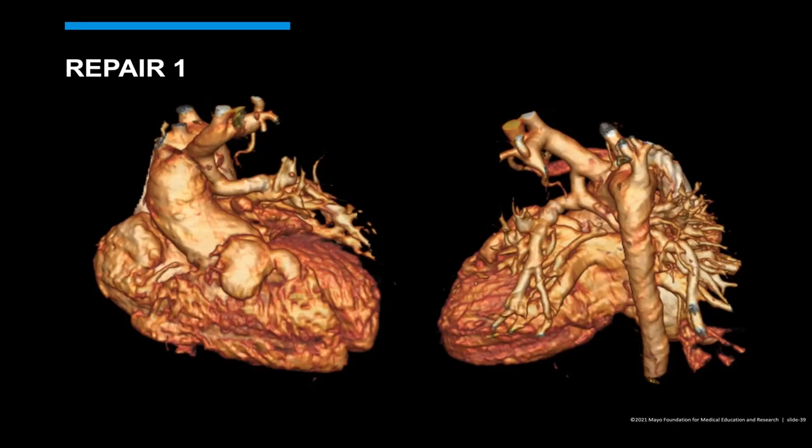Yeah. I'll give you 4 options, and you tell me which one it is. Is this a Potts shunt, a Waterston shunt, a Blalock-Taussig shunt, or a Glenn shunt? Okay, so I know Glenn is like SVC, and I think Blalock-Taussig is... I would guess Blalock-Taussig. You would be correct.